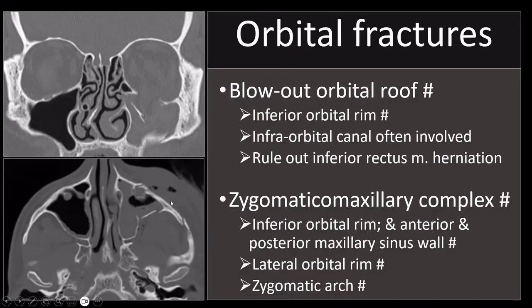If you look at this fracture, look especially over here at where the zygomatic bone and the maxillary sinus meet. This looks displaced, and this will be visible aesthetically, and it can also lead to dental malocclusion, which is also a reason to correct these fractures surgically.